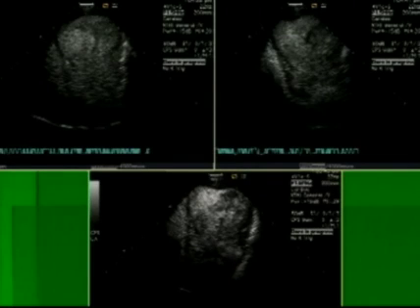These are contrast images, roughly the same images on the two top panels as we saw on the last, and then another example of an apical four-chamber with a little bit brighter contrast in the bottom panel. And we can see here that, in fact, there's contrast swirling. There's definitely stasis. But we don't see any protruding masses in there. We do, however, and this is best illustrated in the bottom panel, see that there is a mural thrombus layered in the left ventricular apex.